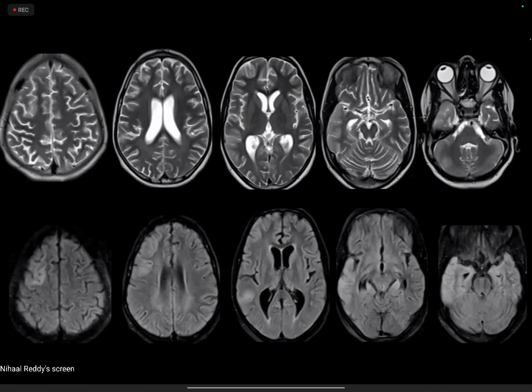All right, I'll open the case for any further suggestions, comments. Here the cerebellum is also showing a little atrophy, and the previous cases also had cerebellar atrophy. Another thing we failed to mention previously, the two cases of POLG: the inferior olivary nucleus, we have to specifically see whether any HOD is there or not, because POLG disorders can show a hypertrophic olivary degeneration like picture.